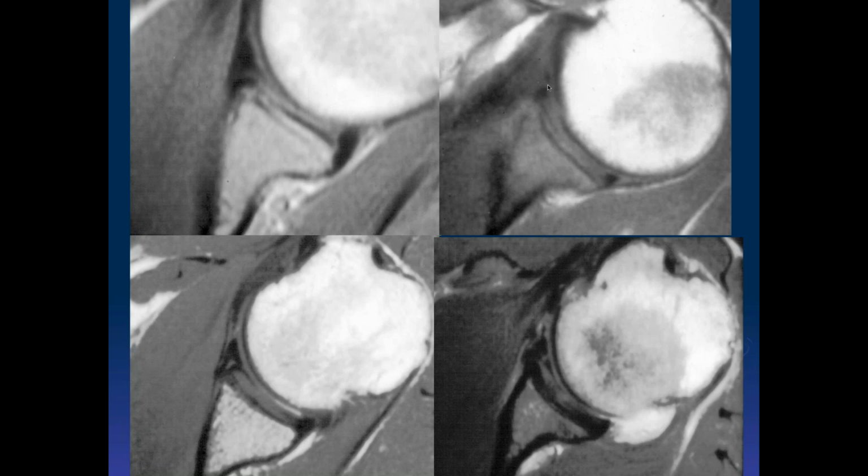If you have linear signal outside that area in the labrum itself, that's an indication of a labral tear. Here we have two signals, the cartilage and another signal here that wraps around. That's a labral tear. And here we have a signal going in a perpendicular direction, and that's a labral tear. So this is actually normal, and the other three were all confirmed labral tears.